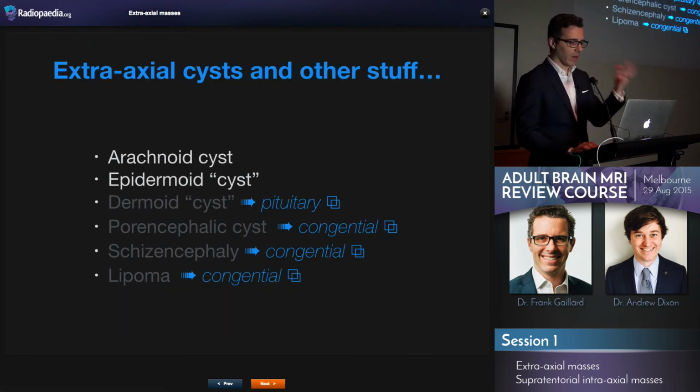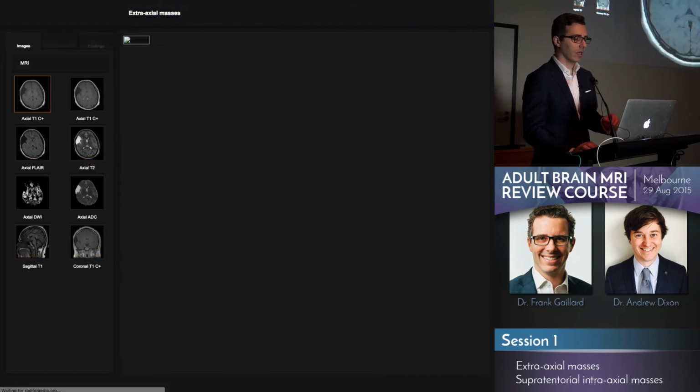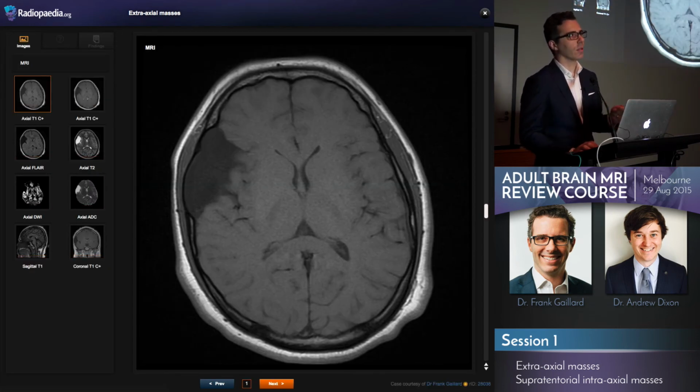So now moving away from our masses and looking more at cysts, or extra-axial cysts, there's only a couple that I'm going to talk about in this lecture. Arachnoid cysts, I think, are really important to be aware of, and there are a few ways of distinguishing small arachnoid cysts from enlarged CSF spaces.